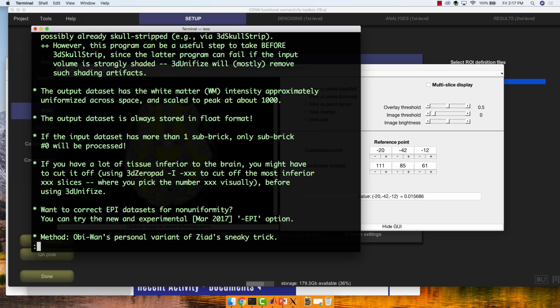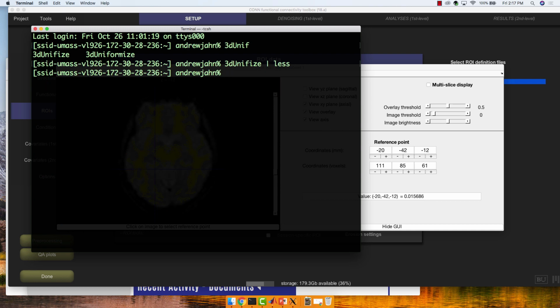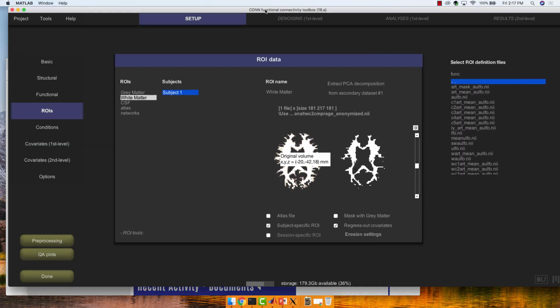Yeah, so it's going to try to normalize the white matter intensity, right? So it's all going to have the same value. So that should be very clearly dissociated from the other tissue types. I'm guessing you're probably not going to run into this problem. I'm just trying to anticipate something that might come up. I haven't needed to use it. It's mainly used when people don't have a good anatomical scan that's not being parcellated correctly in, say, FreeSurfer, and they're not happy with how FreeSurfer is doing the intensity normalization. They'll do it in that.